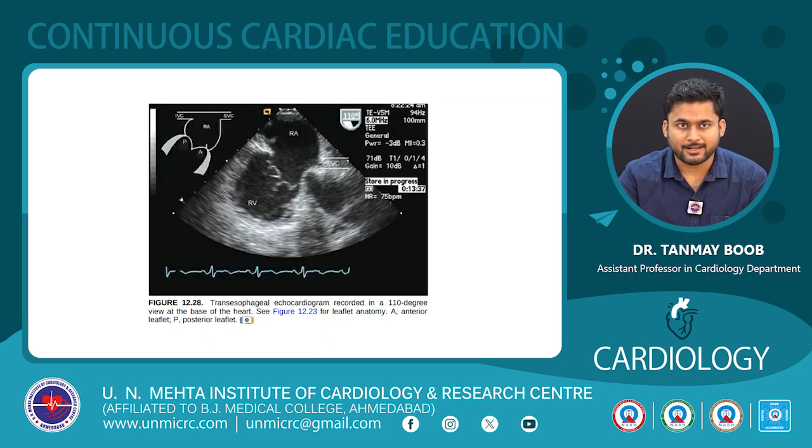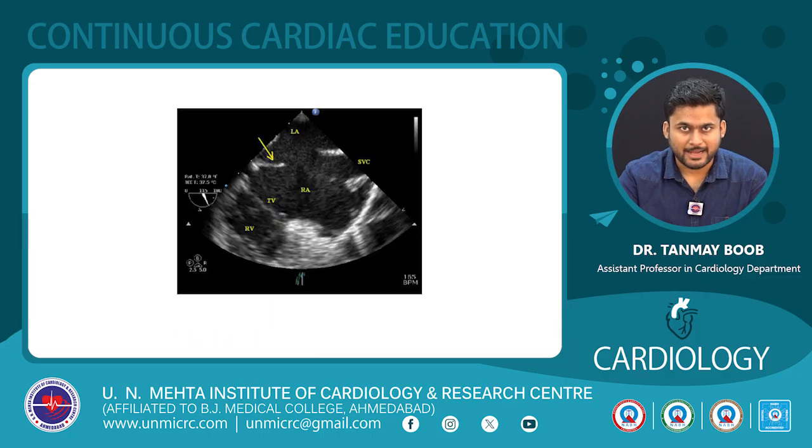And this is recorded at 110 degrees at the base of the heart. In this view, RA, RV, and SVC can be seen as demonstrated. And this is a modified bicaval view showing LA, RA, interatrial septum, SVC and IVC draining into RA, and tricuspid valve between RA and RV.